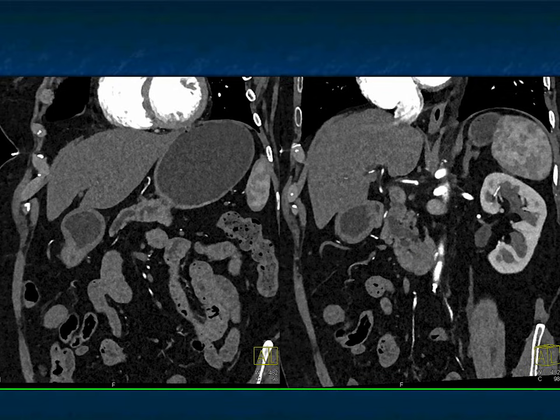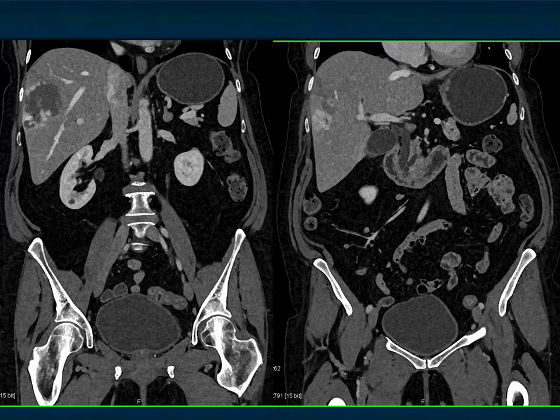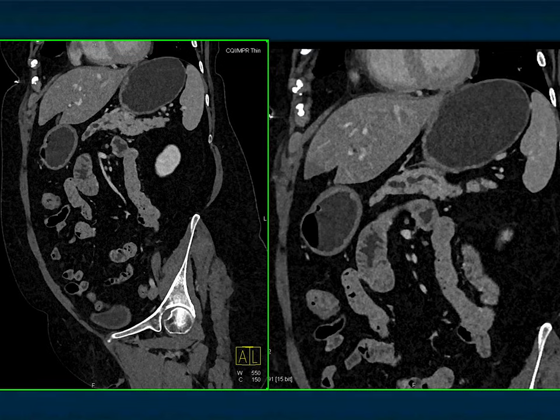Like I showed you before, when you have a dilated common duct and pancreatic duct, you have to worry. Double duct sign, ampullary tumor, a mass in the head of the pancreas, even a mass in the common duct secondarily involving the pancreatic duct. The liver lesion is just an incidental hemangioma of no significance. Image on your right nicely showing you the double duct sign.